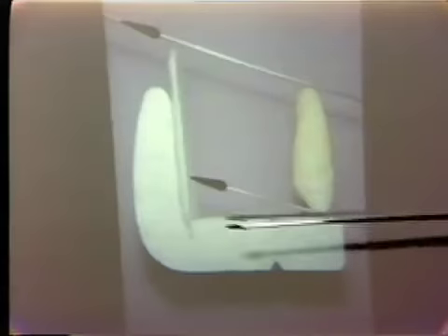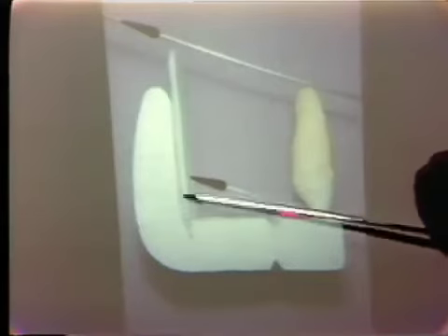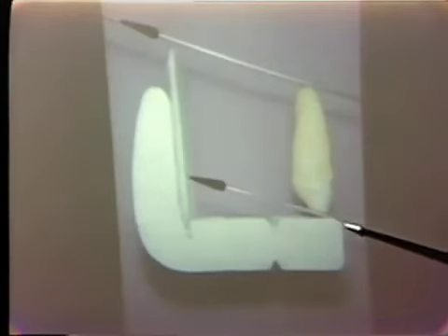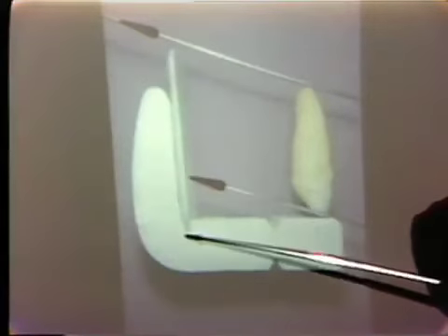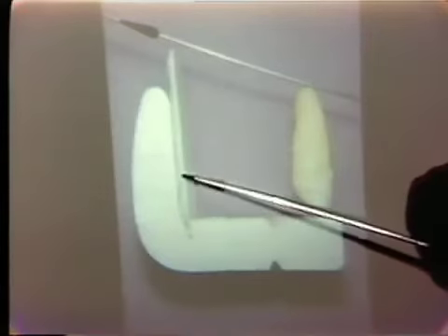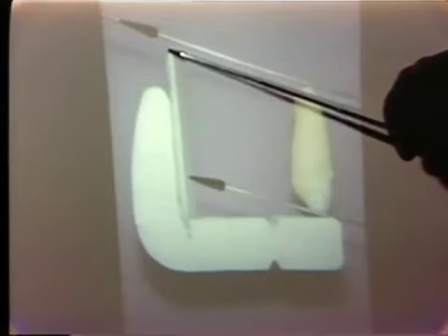Another type of error is where we, instead of directing the rays parallel to the block, may accidentally direct the rays upward in this manner. So then the image of the incisal edge is cast high up on the film, and all of this amount of film turns out to be black border. For every millimeter of black border that we have added, we are losing at the other end of the film.